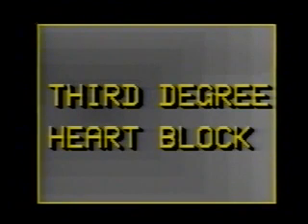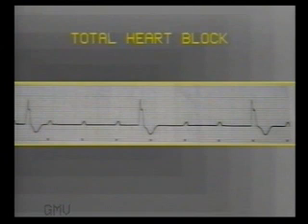Now we come to a third degree heart block. Observe this ECG. You can see P waves at regular intervals at a rate of 100 per minute, and there are QRS complexes also at regular intervals at a rate of 30 per minute. But there is no fixed relationship between the two. That is, the atria are beating to their own sinus rhythm and ventricles are beating to their own ventricular rhythm. Impulses are not going across the AV node to the ventricles. So this is third degree AV block or complete heart block.